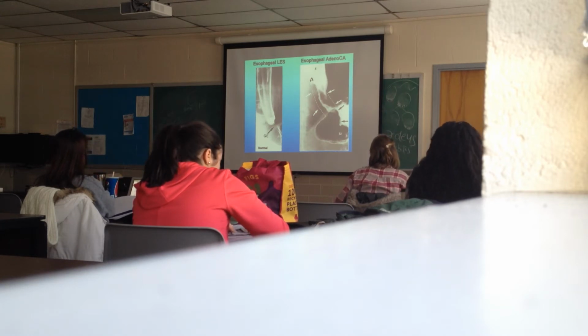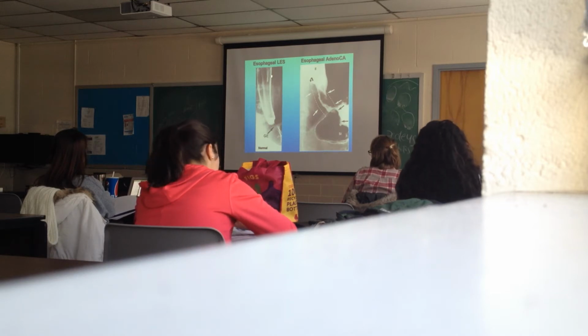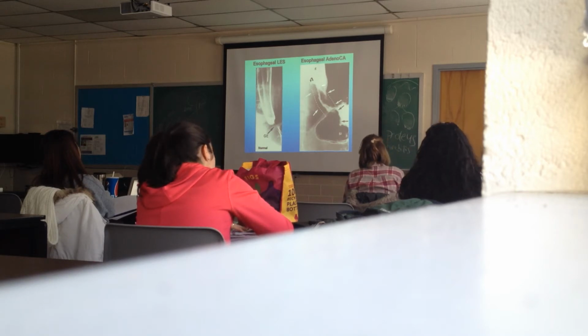You can see that when the LES is closed, the esophagus tapers smoothly to a kind of round point here. There are no irregularities. It's got a smooth contour. No abrupt changes. Over here you can see an example of an esophageal adenocarcinoma. Stomach is here, esophagus here, and the LES is right in this region.